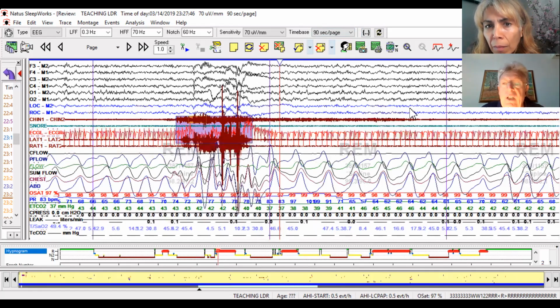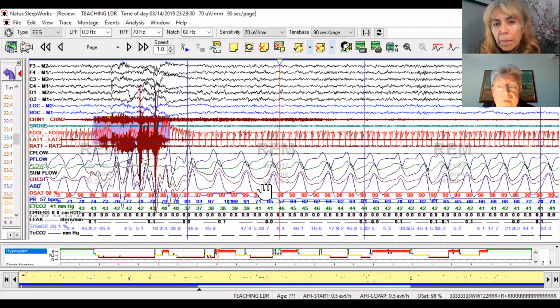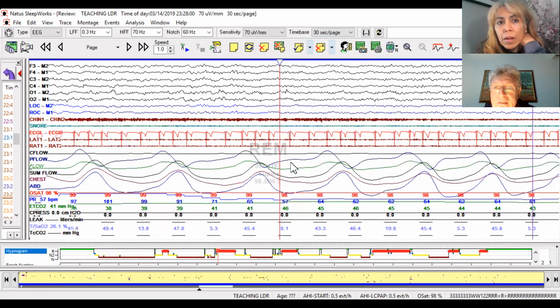No, here, if I remember correctly, you need the occurrence of some eye movement. But there are no eye movements here. Yes, some slow eye movement to change the scoring of REM. Oh, I see. You're correct. Yeah. Or the occurrence of clear N2 potentials, which, yes, go on, go epoch by epoch now.